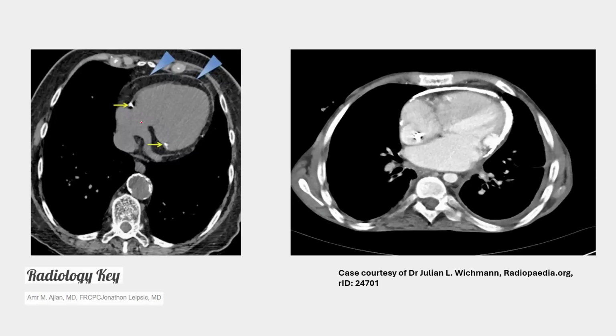If we look here, this one is fat. This is epicardial fat. And this one above is pericardial fat. And this one here is the pericardium. Okay?